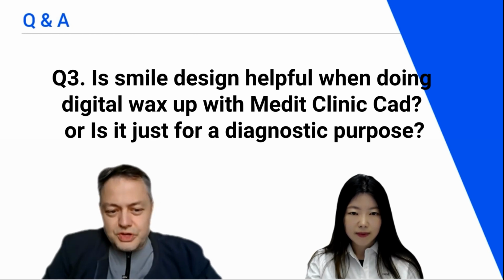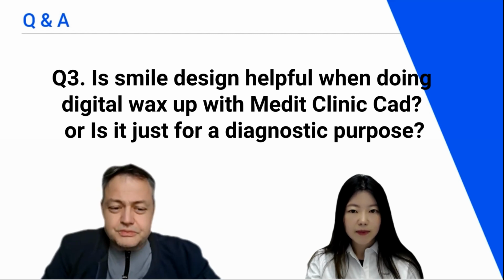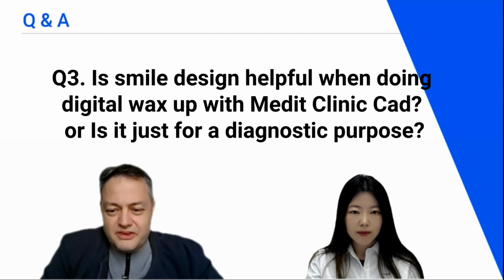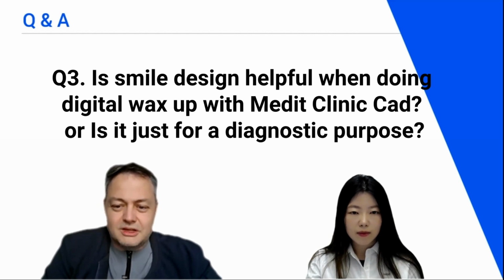And as I showed you in the webinar, you place a grid over the teeth you are working on. And now because you have the values from Smile Design, you are going to be able to adapt the teeth that you are working on with the grid. For example, if you have 5 millimeters of width for a tooth, you're just going to use the grid to get it to that 5 millimeter, because every square is 1 millimeter. So it's going to be easy to adapt the teeth you already have by the grid that overlays.